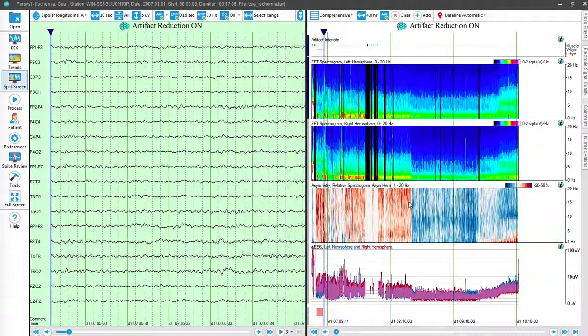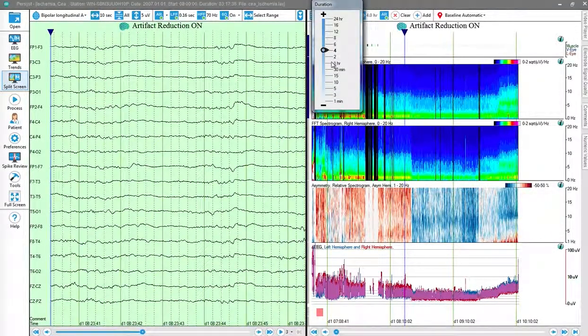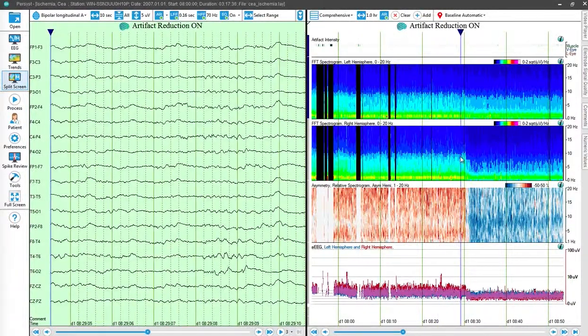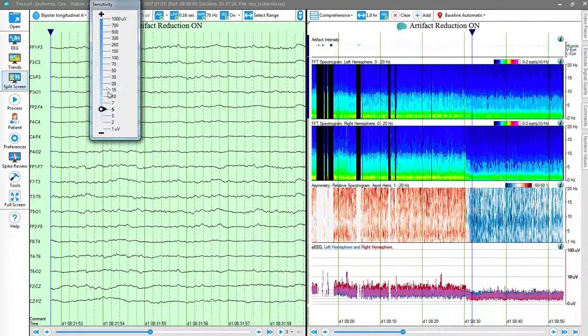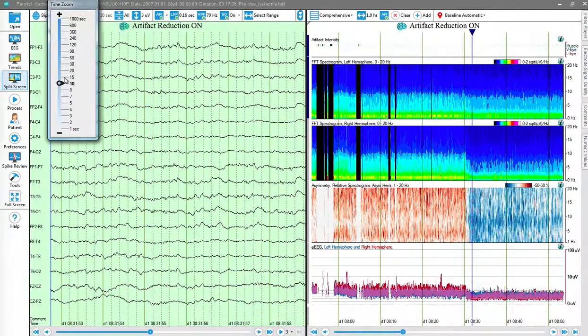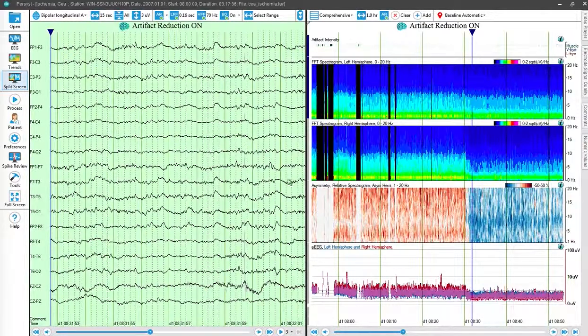Okay. First thing is this is where they've clamped. We can see in the FFT spectrogram some differences here. Let's zoom in a little bit more. We'll go down to an hour. Again, pre-clamp, post-clamp. Let's go ahead and drop the gain a little bit more, down to 3 microvolts. Change the time scale, 10. We'll go to 15 or 20, 15 seconds would be good. What is the difference between this point and this point?